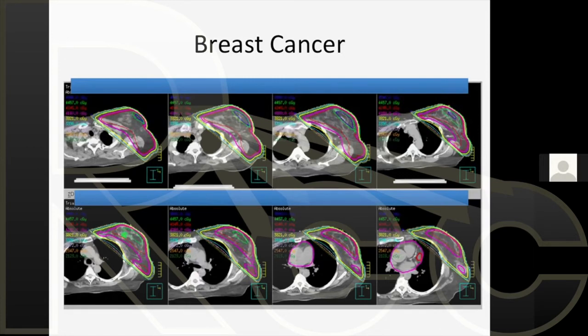So you can teach the patient how to breathe through her treatments so you can also reduce the heart dose without having to look at it. But anyway, let's look at this plan. So what are we looking at?